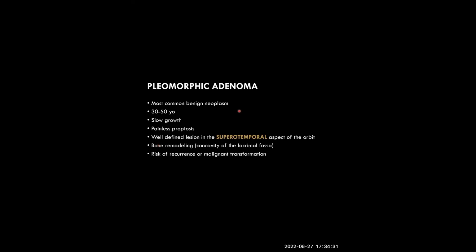You will find here in the diffusion there is no significant restriction. In the MRI there is high signal, but this is the diffusion; it is not so high in the diffusion. It is very low in the T1, and regarding the enhancement, it is almost a homogeneous enhancement.